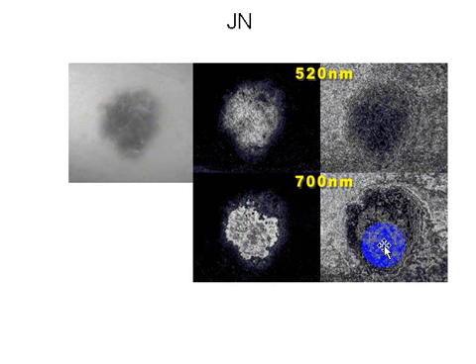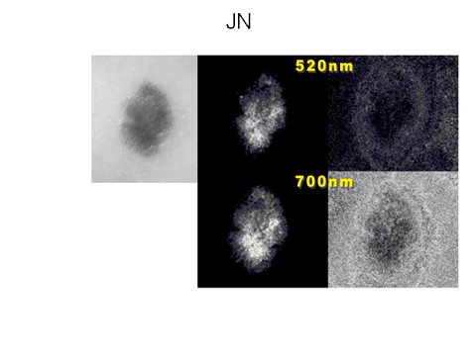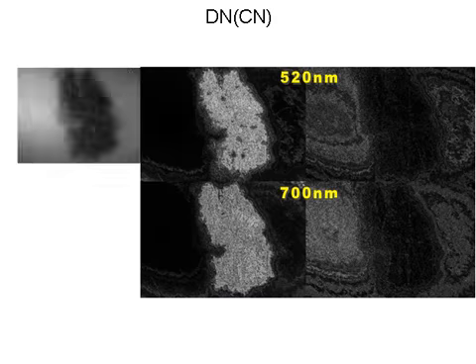Now algorithm 2 shows a hazy area compared to the boundaries, and that's why I say it's not that dangerous. This is another example, also junction nevus. It's a non-tumor or non-cancerous lesion, and you can see that there is no correlation, and that's why it's not dangerous. Let's see another one.